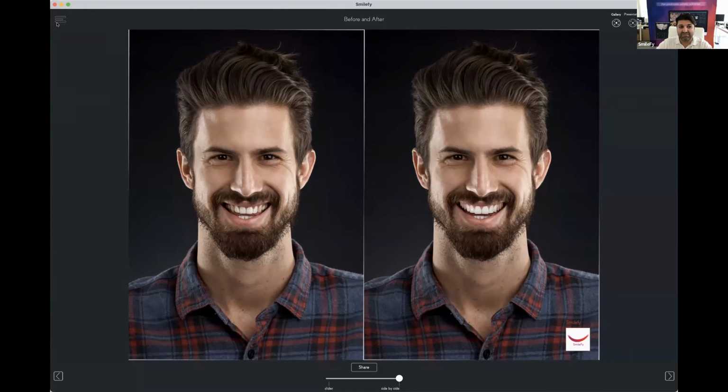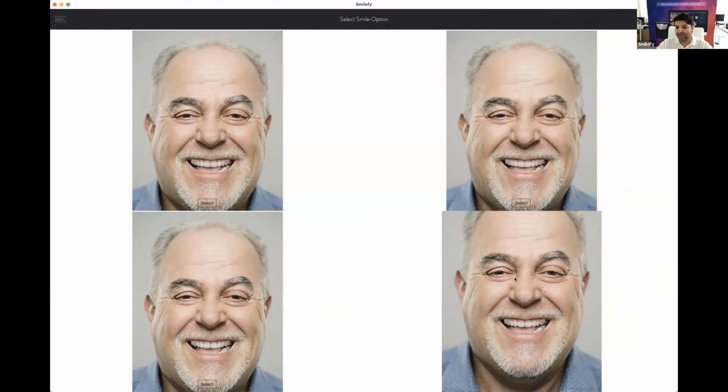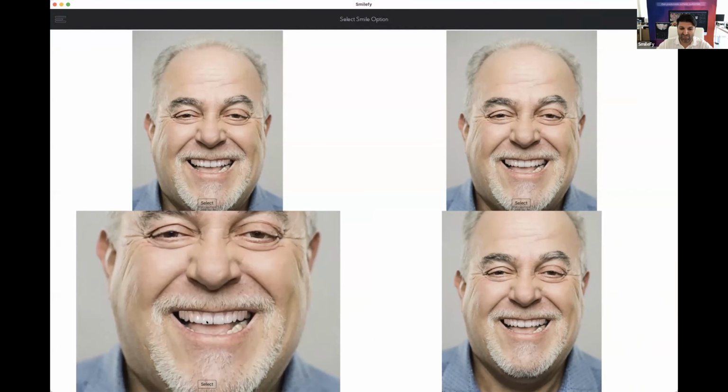Instead of explaining or going into the design and changing shapes and trying to find out what the patient likes, I just click on the picture, I get the smile frame, I click on the smile simulation, it takes me seconds, and I can explain visually to my patient what is the difference between the smiles, right? And you see the energy of the face. Here is more round. Here is the friendly older gentleman. That's more edgy. The square embrasures. Maybe this one, it's too feminine, too much gums. This one is also nice. It is friendly, but is round. It's not very edgy, right?